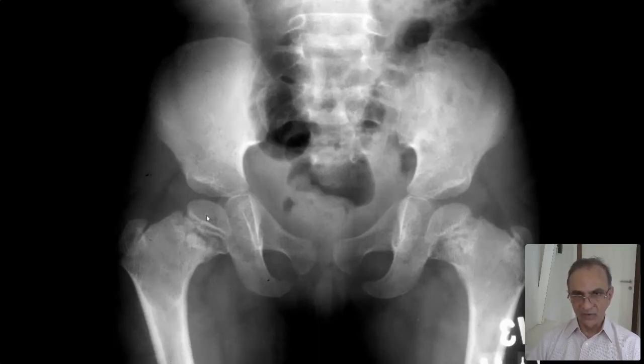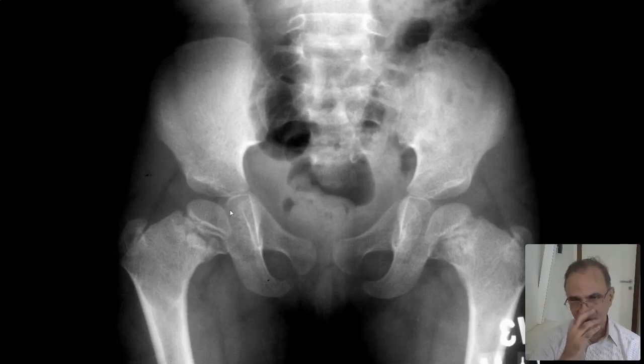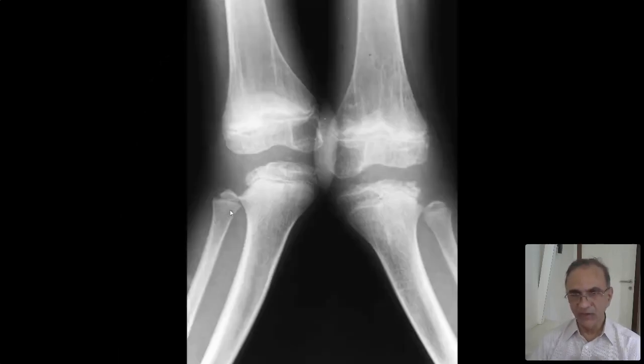Ground glass opacity is fibrous dysplasia. Now, I was prepared for a long lecture. Whether you pick up this as fibrous dysplasia or not is a little okay, but you cannot miss that this is a skeletal dysplasia.